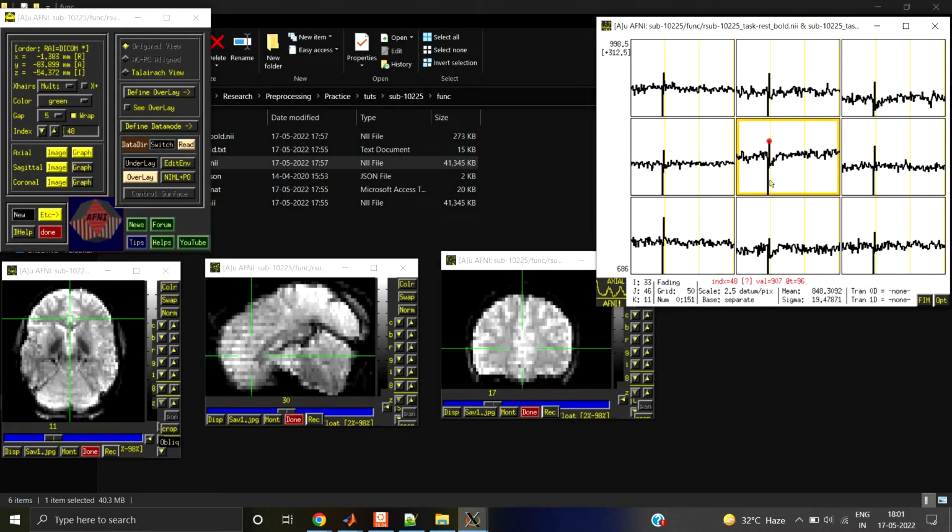This dip now is actually because of a color change. In this particular volume, there was a color change that happened. I'll show you again. You can see there were some artifacts here, where some areas are white and suddenly they become black. This is not because of motion; the actual motion has gone.